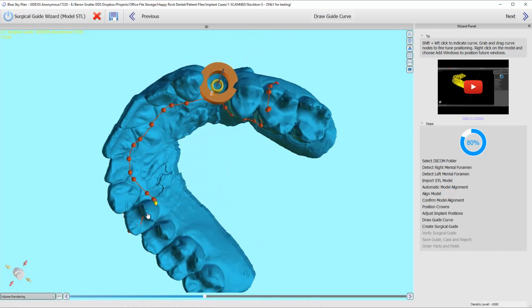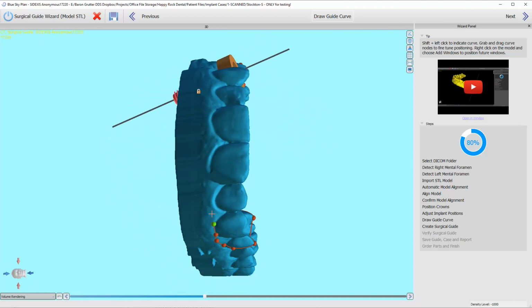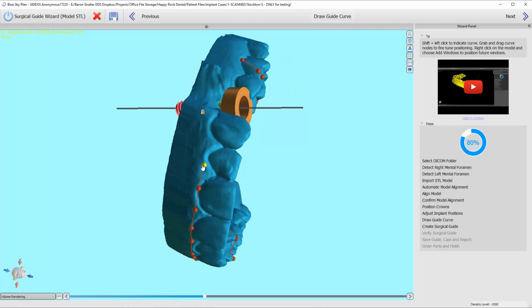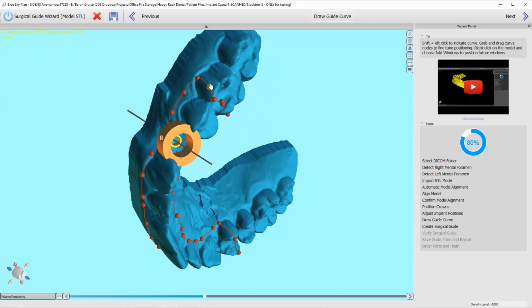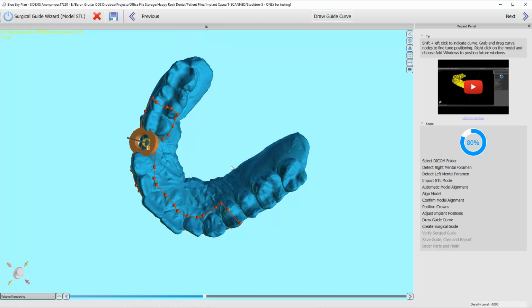That second little line I had in there had a little bit of a difficulty trying to connect. It made it work, but didn't give me any more nodes. I say nodes, I mean these little dots here. And I can always move them wherever I want. If it doesn't connect, you can just drag one over top, or you can draw it all the way to the end line. And now it's solid. You have to connect the dots at the end so it knows where everything truly starts and finishes.